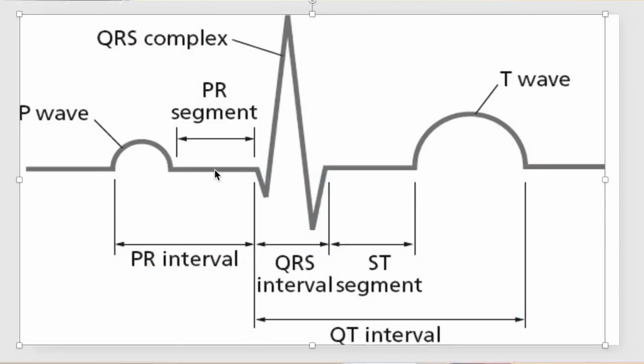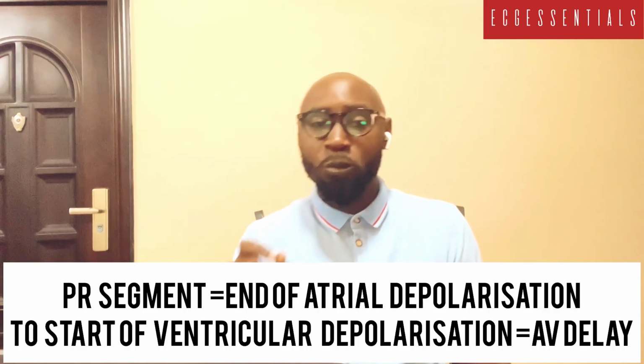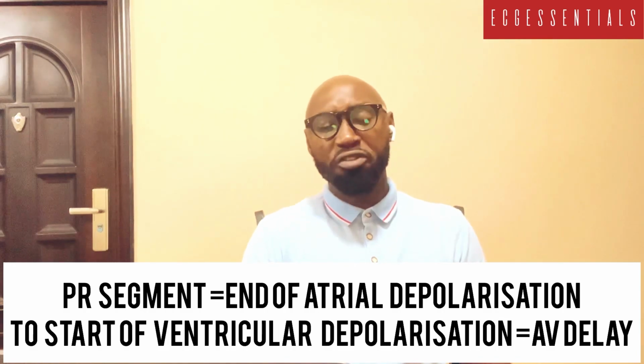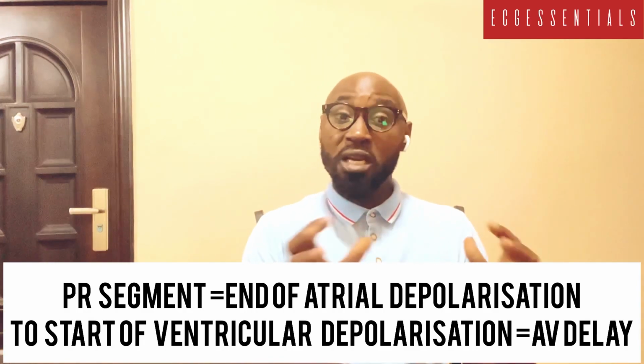Next, we see that there is a straight line that is called a PR segment, as shown on the image. This PR segment is a straight line running from the end of the P wave to the start of the QRS complex. And this PR segment measures the time from the end of atrial depolarization to the start of ventricular depolarization. In essence, we can think of it as a delay in the AV node.